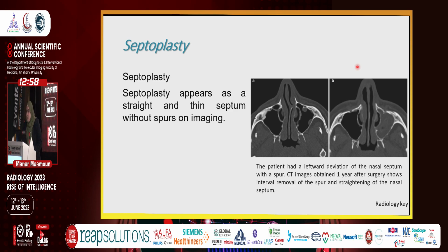Septoplasty is either done in association with rhinoplasty or alone based on the patient's complaint. In post-septoplasty cases, you can notice the nasal septum to be very straight and thin and without any spur compared to the preoperative scan.